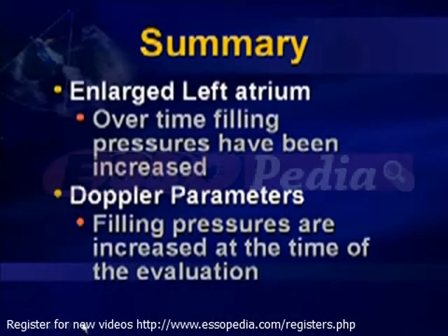So in summary of this first case, we saw that the left atrium was enlarged. And this tells us that in general over time, LV filling pressures have been increased. The Doppler parameters, however, tell us that filling pressures remain increased at the instant and time of our evaluation, and this patient, despite our therapeutic intervention, remains symptomatic.